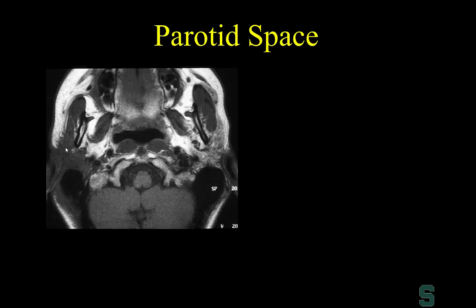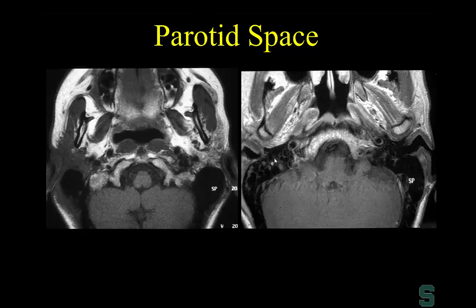Here's another example of where we earn our value in head and neck. Here's an aggressive lesion involving the right parotid gland. Now, if you look at the parotid gland, these tumors can grow deeply and extend between the styloid process and the mastoid bone in the stylomastoid foramen. And with a leap of faith, if you look right at my arrow, there's a dot right there. That's actually the facial nerve in the stylomastoid foramen. So anytime that we have tumors involving the parotid gland, these tumors then can extend deeply to the skull base. And because the facial nerve is located in the parotid gland, we should be performing MRs to determine whether or not there's retrograde perineural extension along the facial nerve.